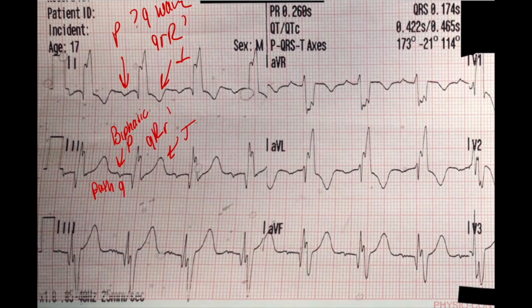In lead 3, it seems we have a kind of fragmented P wave. And we're starting to get these QRS complexes that are just fragmented. If we were to name this, it would be like a QRSS prime, which isn't really a thing, right? So it would be a Q wave here, R wave here, S wave, deeper S wave. But these complicated QRS complexes we just call fragmented.